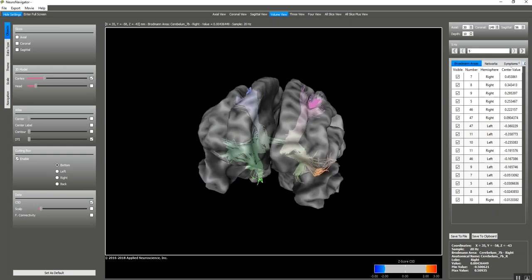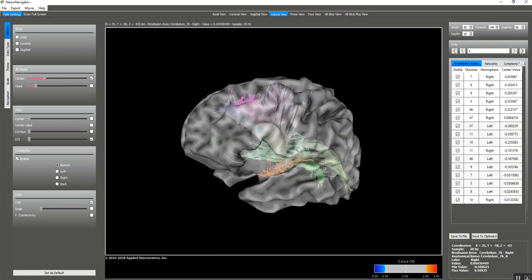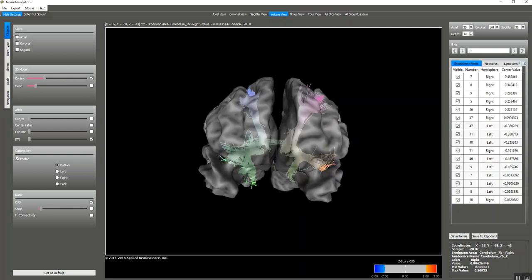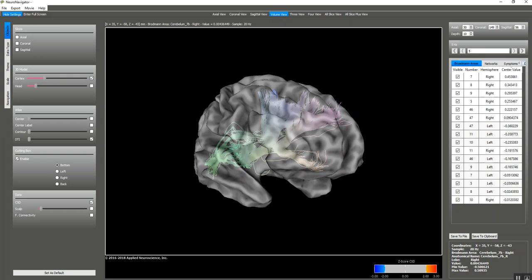And we recommend that you play around with this. It's inside the NeuroNavigator. It's inside the NeuroGuide demo. And even if you don't purchase a Navigator, you can play around with it and learn about how to link together EEG with structural and functional aspects of the brain.